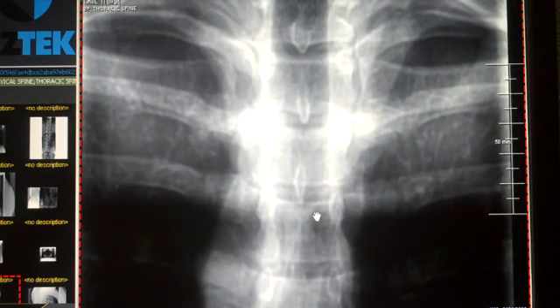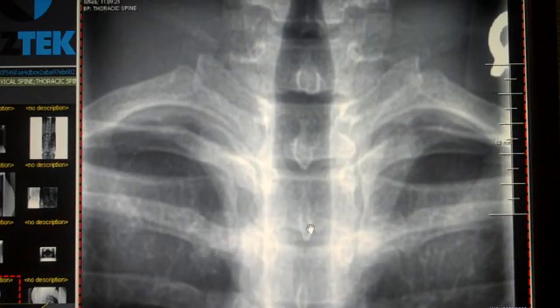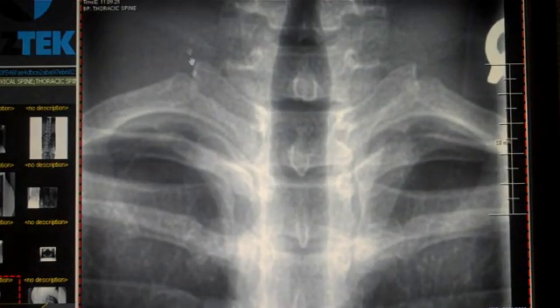If I move on up to the upper thoracic area, let's go up into the very top of this part and look at a close-up of T1. The T1 transverse process goes all the way up. All of that is the transverse process, and the reason it looks so big is because that TP is extended straight out to the side. This spinous process right here is the spinous process for this segment. This spinous process is the spinous process for C7.